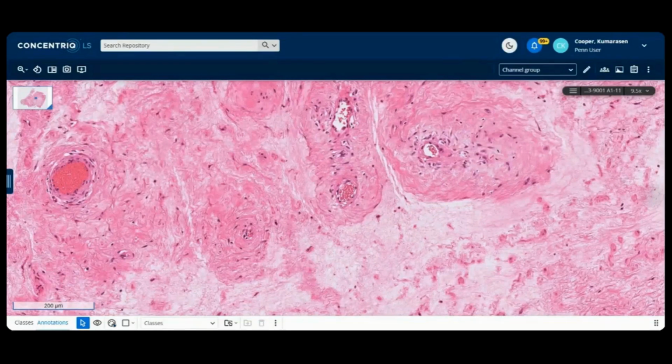Okay, Abu Baker, angiomyofibroblastoma. Okay, you want the truth of it? You are spot on, Abu Baker. That's correct. AFH, I see in deep soft tissue, like in the lung, you can see it sometimes. Those typically, again, have that central sort of histiocyte-like proliferation of epithelioid cells. The periphery has this lymphoid cuff. So those are useful, helpful clues. But thank you for that. And AFH belongs to that group of FET family tumors, because that has ATF1 and EWSR1, just to add to that, I didn't mention that in that group. So it also belongs to that part of the group.